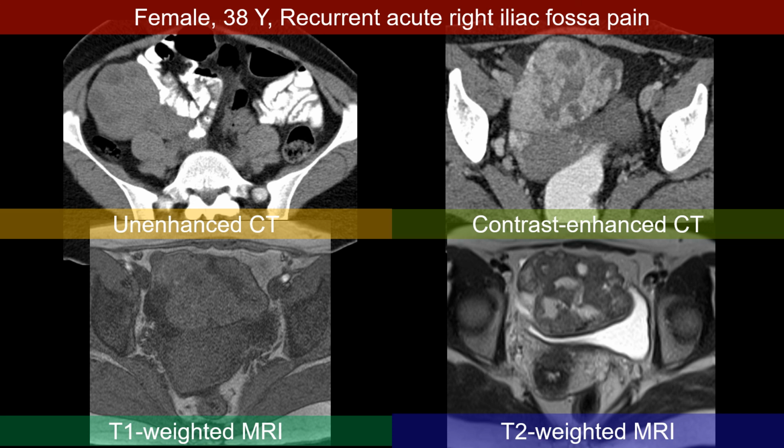A female, 38 years old, with recurrent acute right iliac fossa pain.